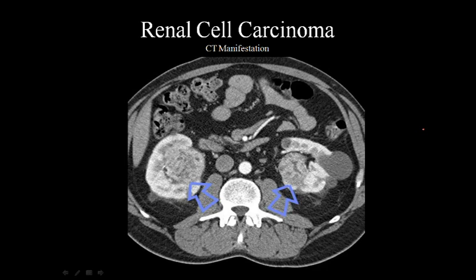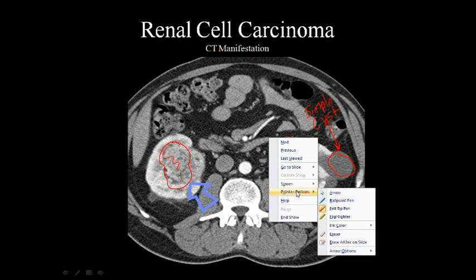Okay, here is an example of renal cell carcinoma. You see that we have this region here, here, and the real impressive lesion is this. Notice that this is a simple cyst. Notice that it's the same uniform density, but we do see these areas here and here and here having some degree of contrast enhancement. Notice how the borders are really not easily defined. Let me erase.